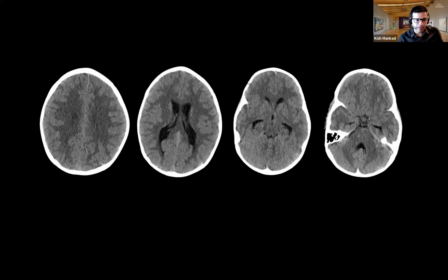Your options are: A, you think it is safe to proceed, you do a lumbar puncture. B, you don't know why the ventricles are looking a little bit prominent. Are they normal for a 3-year-old? But if the ventricles are prominent, then the gray-white differentiation of the brain looks quite preserved.